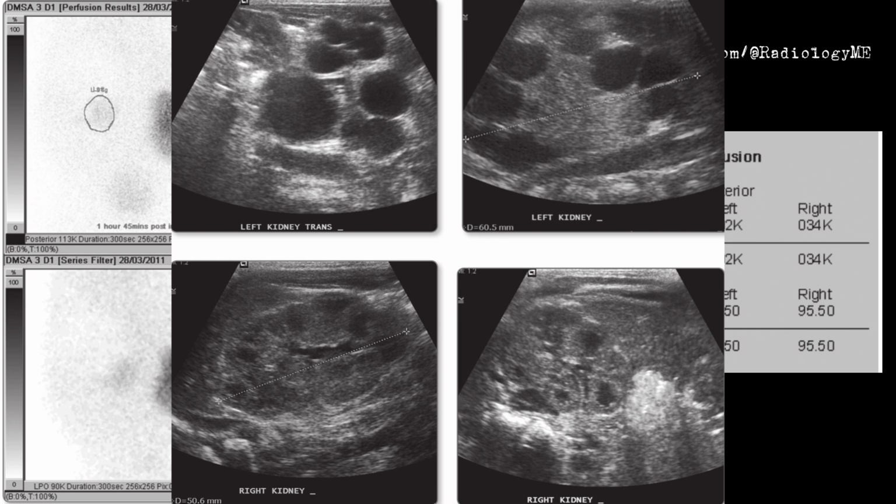The right kidney, on the other hand, looks fairly normal for a young child and measures around 5 centimeters in length. This makes me even more confident in the diagnosis of a left-sided multicystic dysplastic kidney. The absence of normal renal cortex and the presence of large cysts are classic features. This condition, MCDK, is a congenital anomaly where the affected kidney is filled with non-communicating cysts and lacks normal function. Now, if this was an antenatal diagnosis, the size of the cysts and kidney could have been picked up earlier. It's interesting to note that affected kidneys often regress over time, although they may remain non-functional.